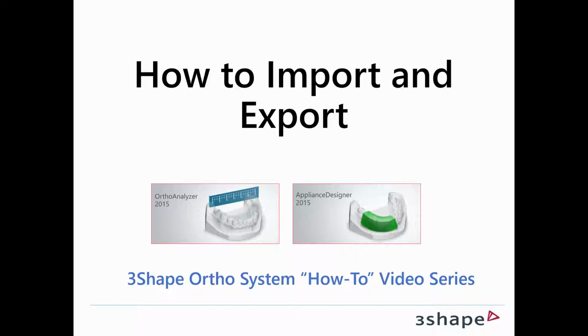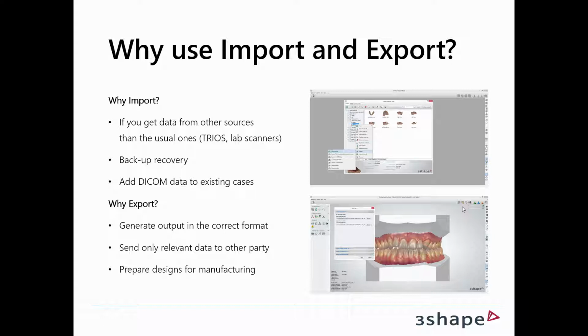Hello Tim. Hey. So why use import and export? Well, import if you get data from other sources than the usual ones like trios and lab scanners, if you need backup recovery, or if you add DICOM data to an existing case. Also as concerns export, if you need to generate output in the correct format, or you need to send only the relevant data to other parties, or if you need to prepare the design for manufacturing.